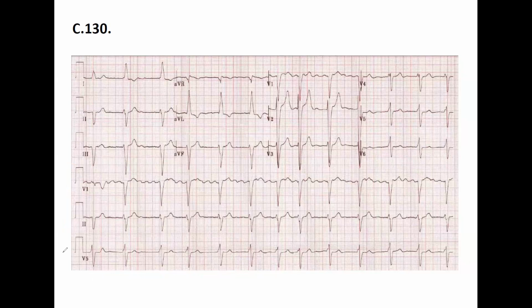P wave. There is a P wave. Where? Not on V5, but here, for example, some kind of wave that you do see here, yes, in V1. But this is not a normal sinus P wave for sure. And the rate is very fast. So this is arrhythmia, no P wave or very fast P wave, more than 350.